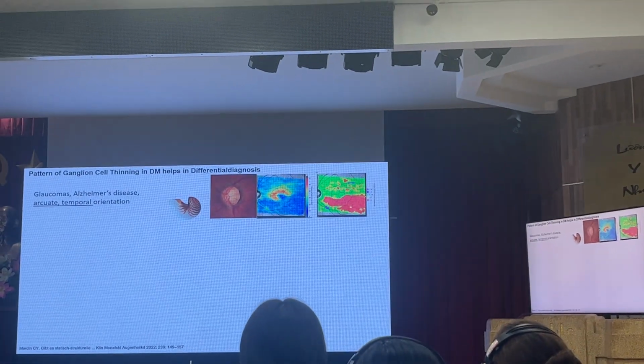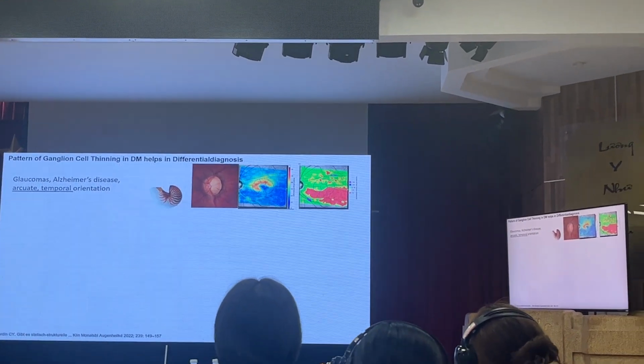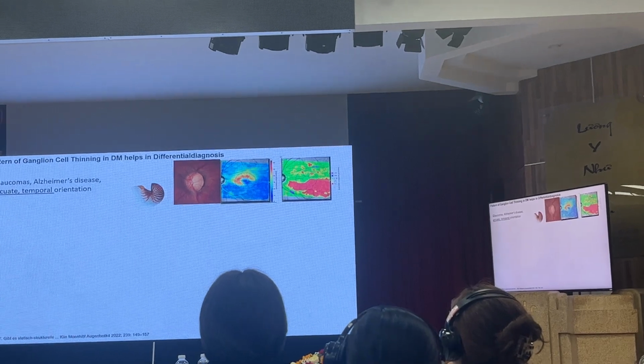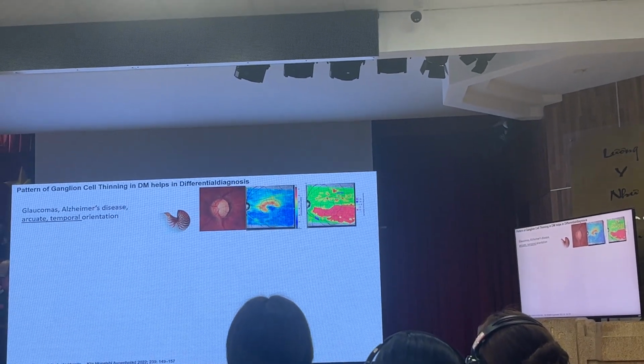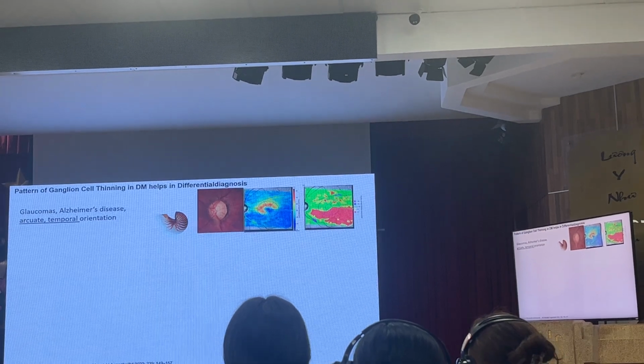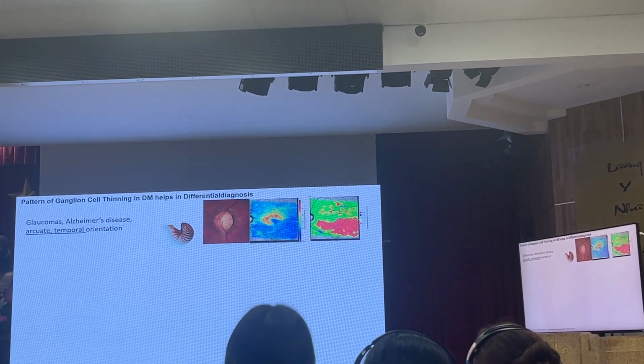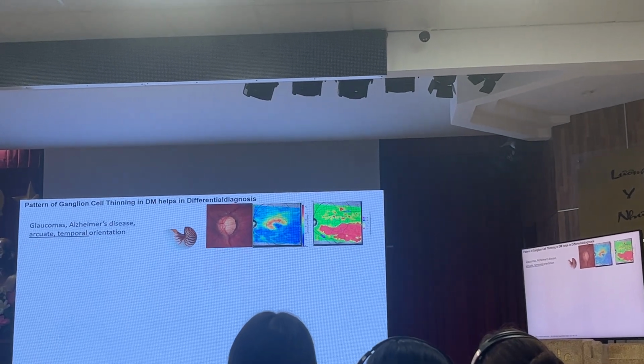So you know this graph, but repetition is a kind of didactic instrument, and therefore again, in neurological diseases, it's worth having a close look at the ganglion cells, and if you have this nautilus shape, loss of ganglion cells, you think more of glaucoma and Alzheimer's disease.